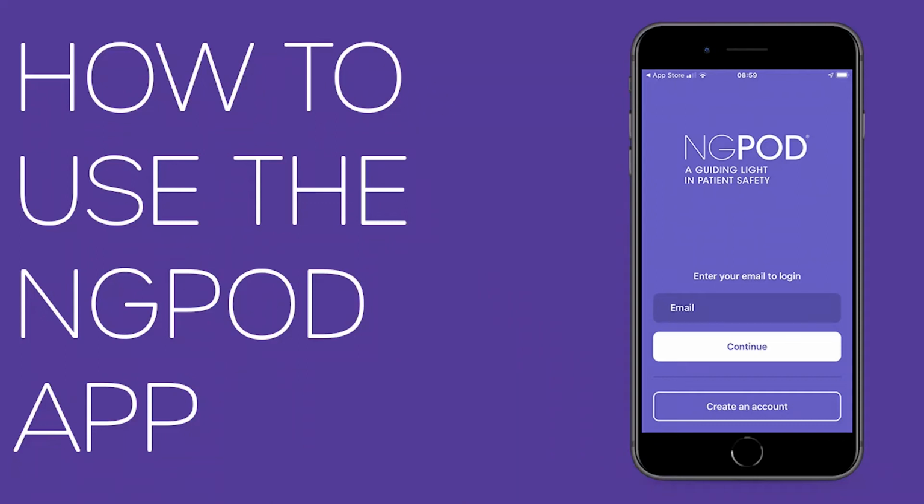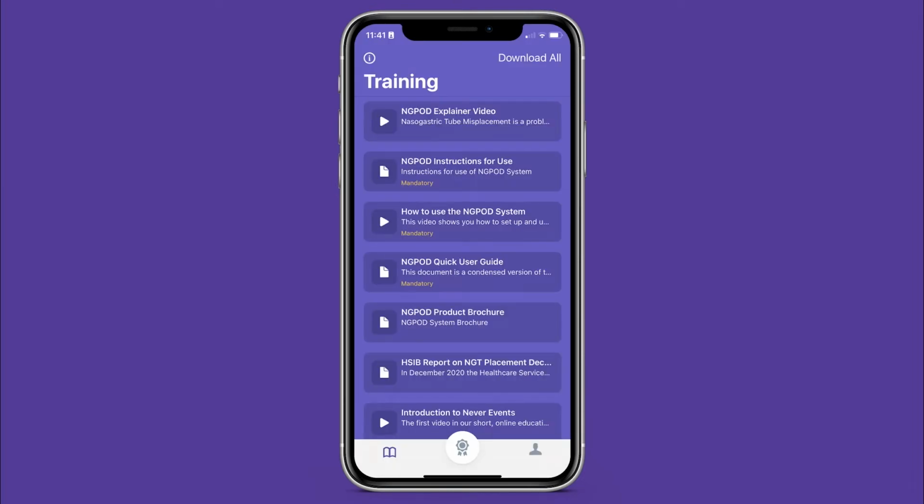How to use the NGPod app. After downloading the NGPod app, you will have an icon on your mobile device that looks as shown in the picture. When you press the icon, the app will open and you will see the training screen, which contains a number of resources. Simply press each resource to access it.